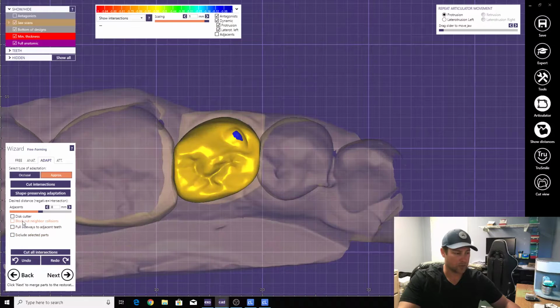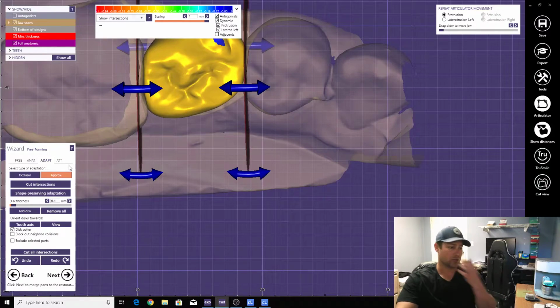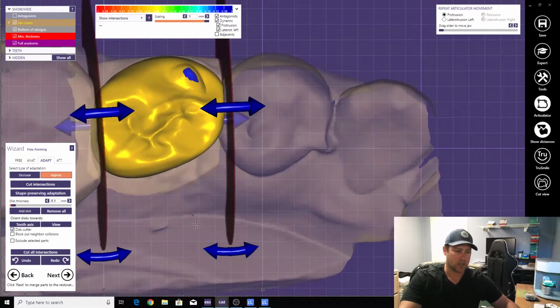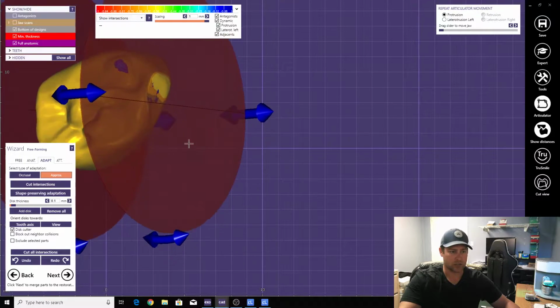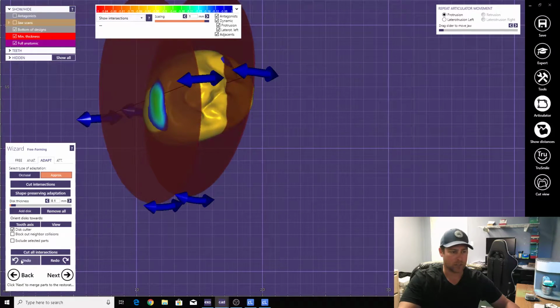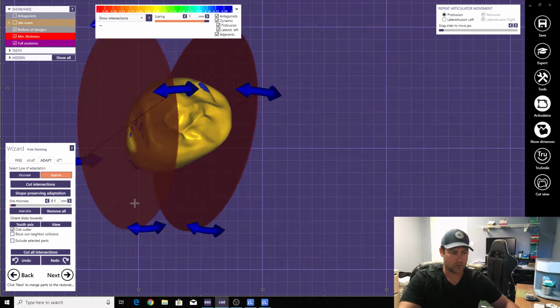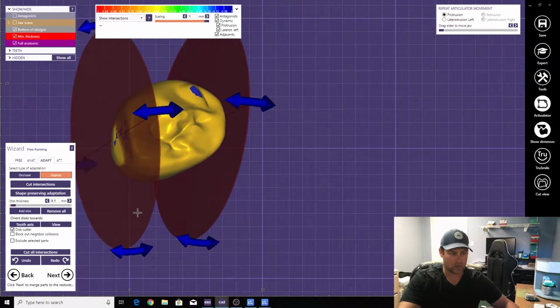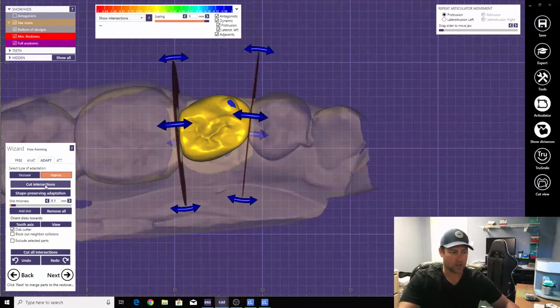Very last thing we want to do is use the disc cutter tool. And this is actually an attachment that you can do too, but they've added this, which is a very nice new feature, to cut any undercuts in your contact. So we'll come over here, turn these adjacent on, get this lined up here, go back, redo. There we go. Get these undercut contacts. Alright, just make sure we're lined up with the contact pretty good. Alright, we'll go ahead and cut.